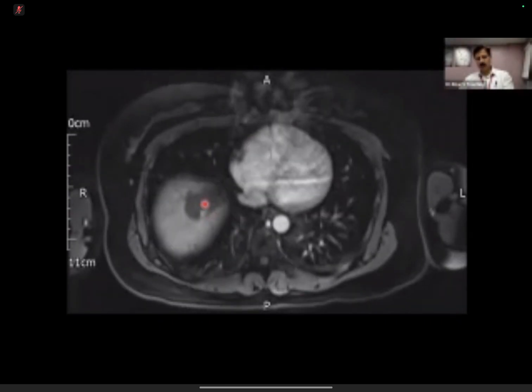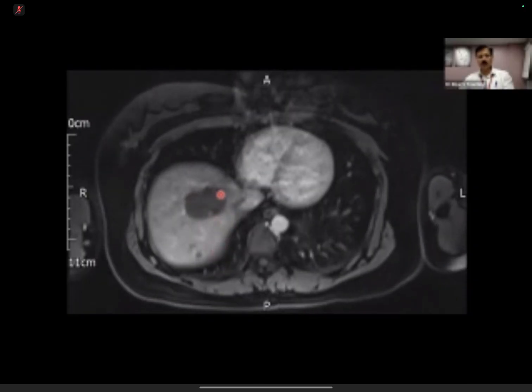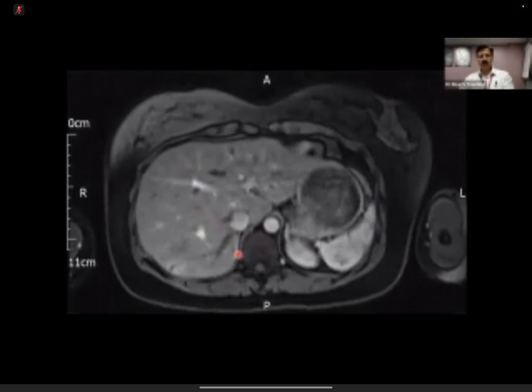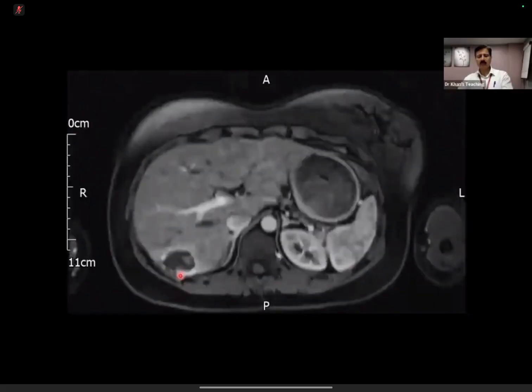You see on this lesion, see that there is enhancement, and this is in the periphery, and this is nodular, it is not continuous. And some nodularity here, some nodularity here, some nodularity here. And look at this lesion, and again, there is nodular enhancement and discontinuous here. So this is, and look at the signal. This signal is equal to the blood pool.